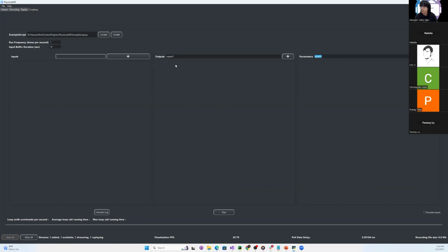Okay. And it will broadcast a new stream with the name dummy 8 channel modified. And here we can specify the run frequency. So sometimes we may want a lower latency. So let's just say we want to run it maybe 20 times per second.